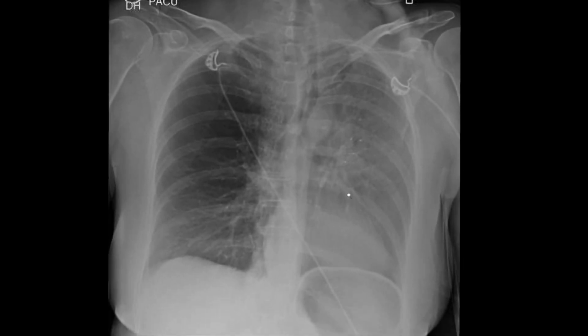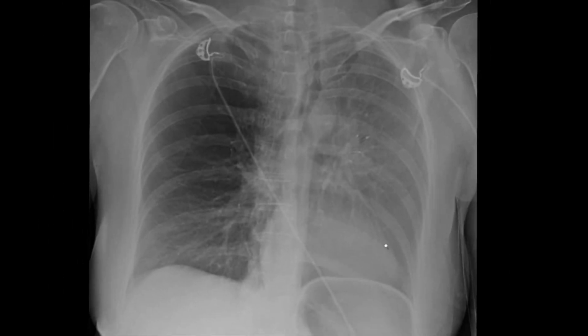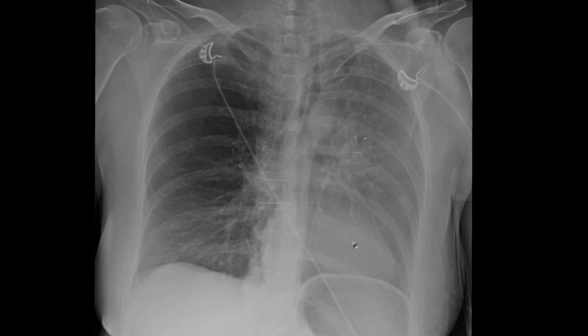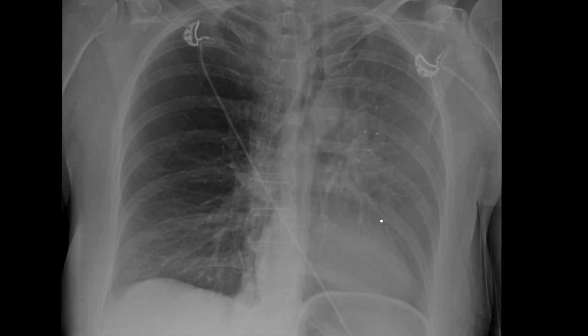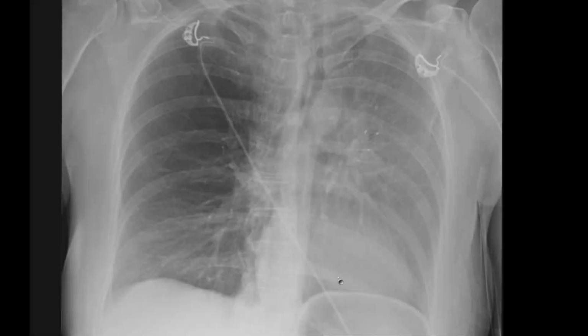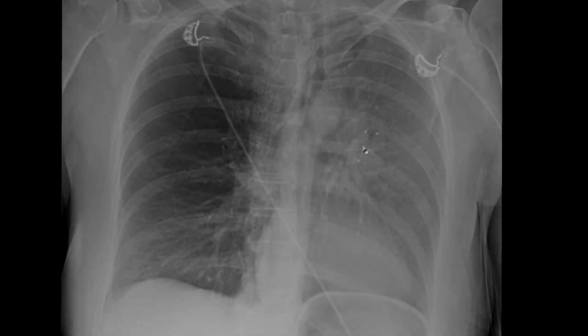So first you can see that they put in a total of 3 valves on the left side. And we have findings of substantial upper lobe volume loss. The finding that I initially went by, because I was really fixated on this, is that if you look for pulmonary vessels down here, they really stop right there. And down here, we do not see vessels. So I'll try to bring that out. But initially, I did not perceive that. So certainly we have a lot of volume loss.